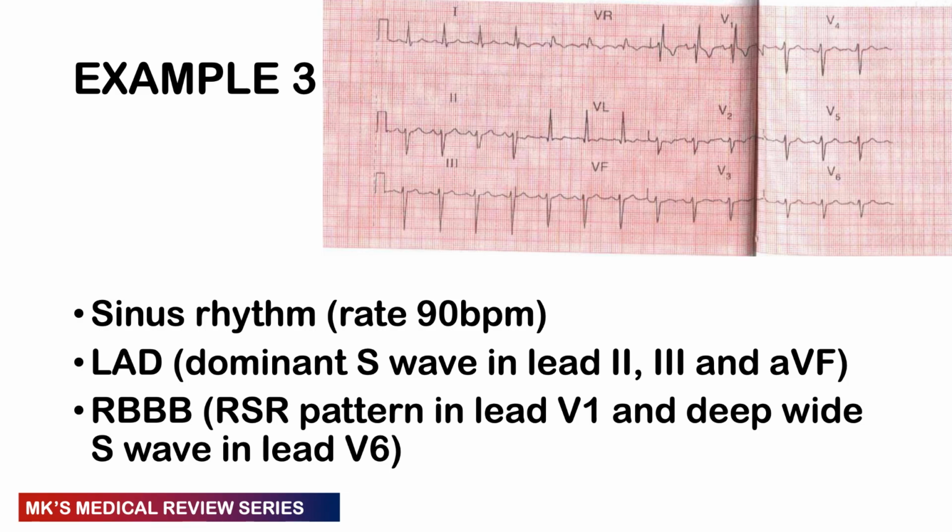We come now to look at our QRS. You can actually even look at our PR interval in this case, but I won't spend much time looking at that here. We look now at our QRS complex assessment. We look at our leads here. Lead 1 is facing upwards, lead aVF is facing downwards, lead 2 is facing downwards, so that is a left axis deviation, which is significant. So we have a left axis deviation here.